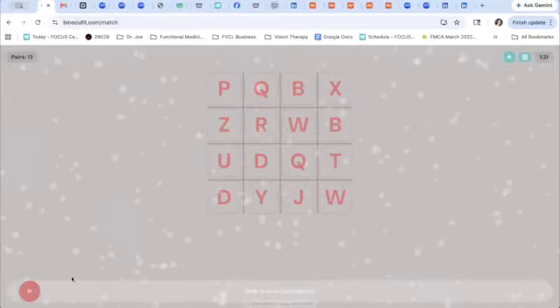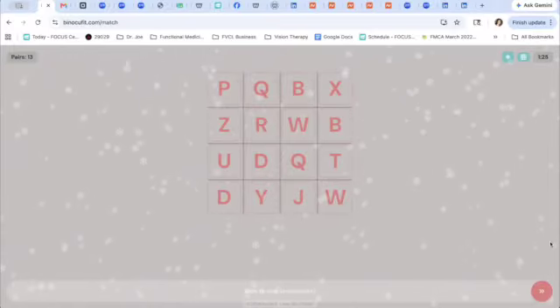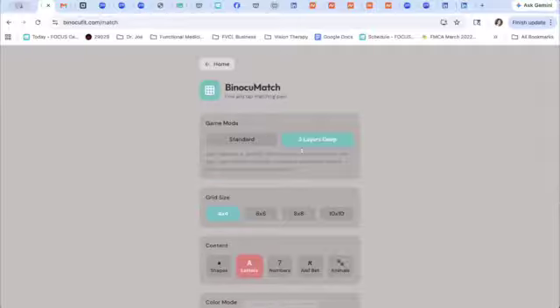Again, I'm not going to take my time to do that whole thing. You get the idea. So I can get out of it like that, but it will show on the data given to the practitioner that that activity was not completed, right? If you abort it midway with that slider on the bottom.